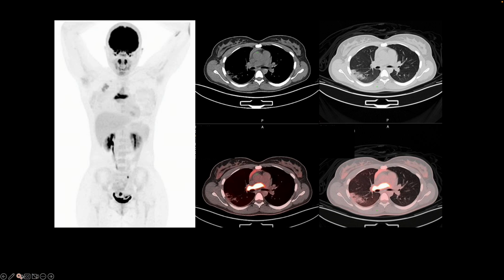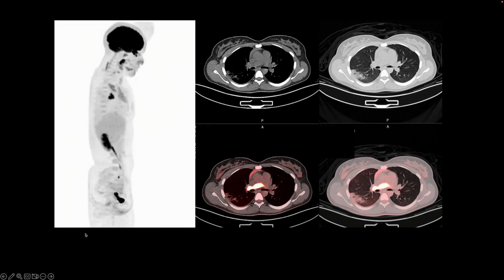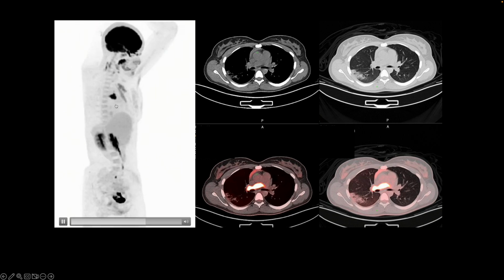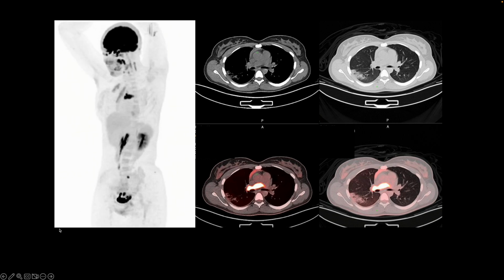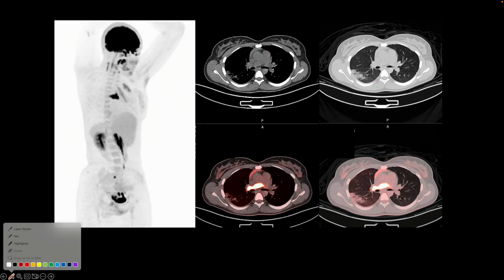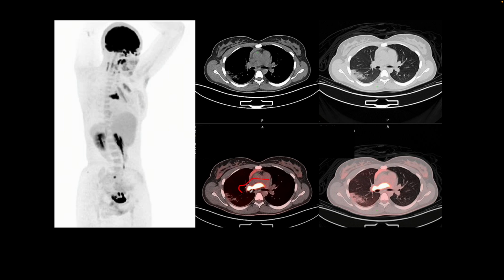So the patient underwent a whole body FDG PET-CT, and we will start by reviewing the rotating image. We see this focus of intense uptake in the chest. This focus corresponds to the tumor that I showed you before from a contrast enhanced CT, seen right here. And we don't see the tumor as well on this low dose CT without contrast that comes with FDG or a whole body PET-CT. We do see faint inflammatory uptake from the right upper lobe lung infarct.